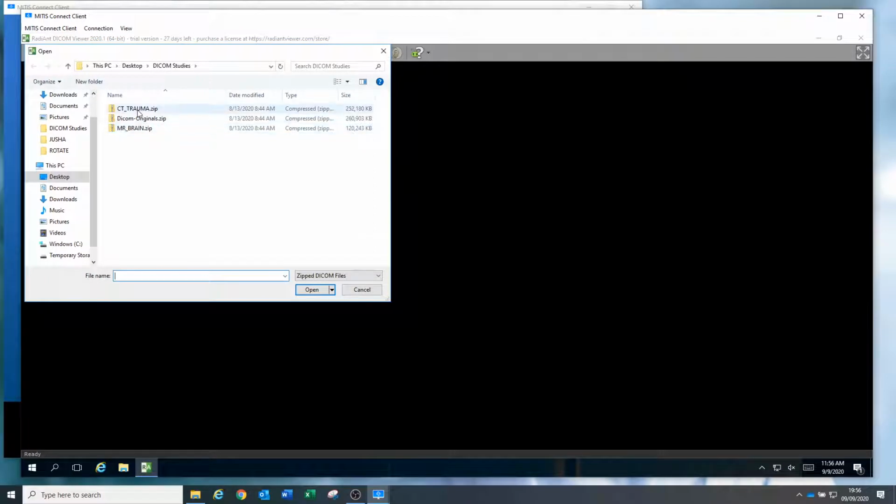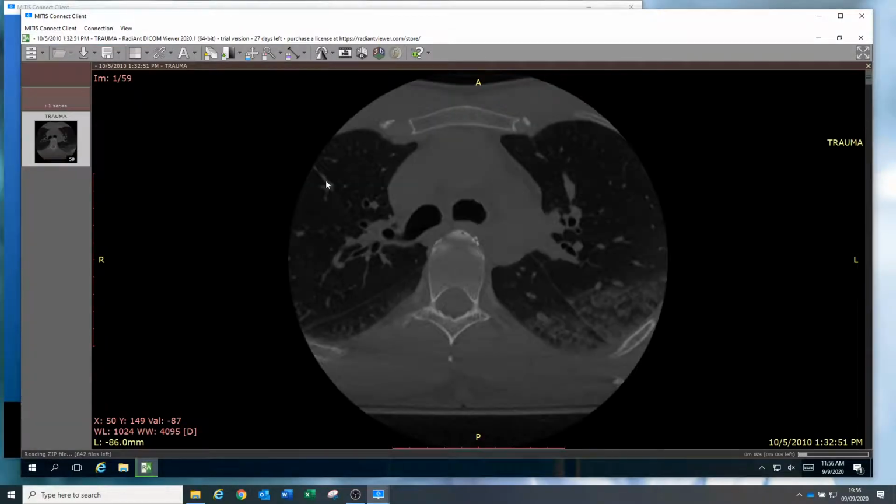We'll open up the study now, and we can see that the images, now this is a 901 slice CT scan, have already loaded and have been assimilated into the Radiant PACS ready for reporting. It's worth noting that a CT scan of this size would take considerable time to download via VPN to the radiologist's workstation from home. Obviously, using the MITIS gateway and appliance, we are streaming the DICOM image across, so there is no big data set transfer out of the hospital.